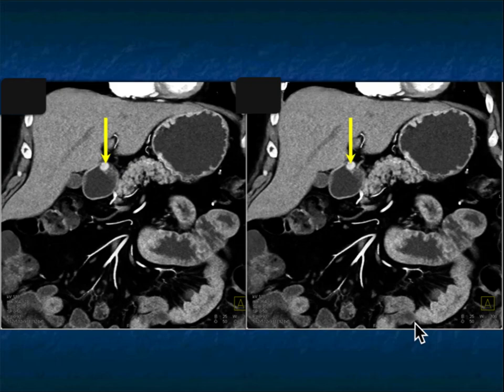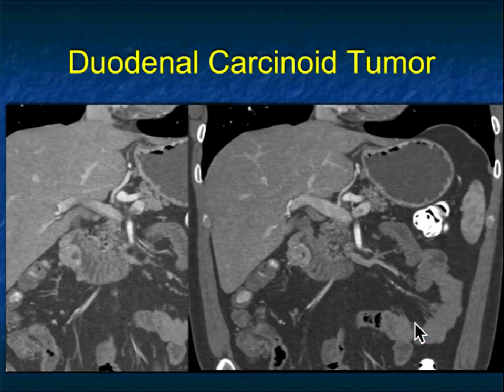Yes, if the patient had renal cell carcinoma, you could think about a MET. That's rare. If the patient had a GIST tumor, occasionally GIST tumors can look very similar and commonly occur in the duodenum. GISTs often grow exophytic. Sometimes GIST and carcinoid look the same, but carcinoids stay intraluminal. GIST tumors tend to be intra and extraluminal in their appearance.